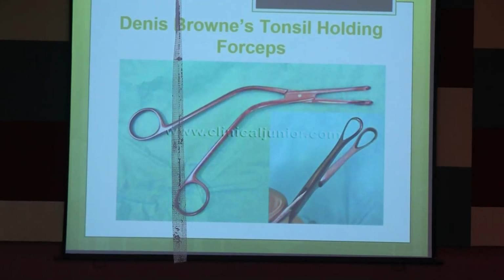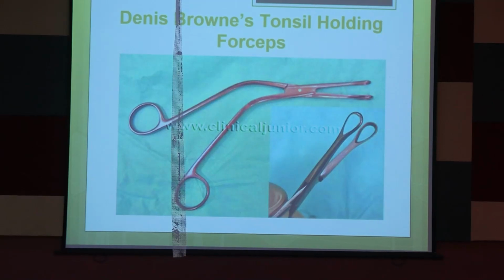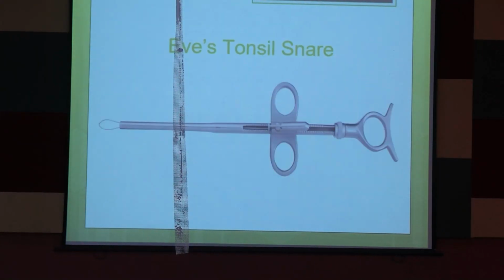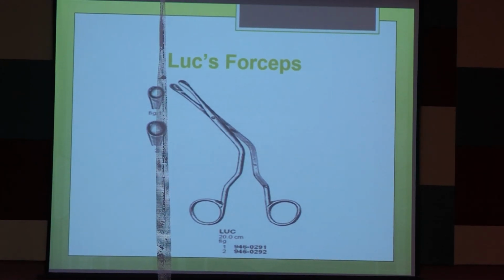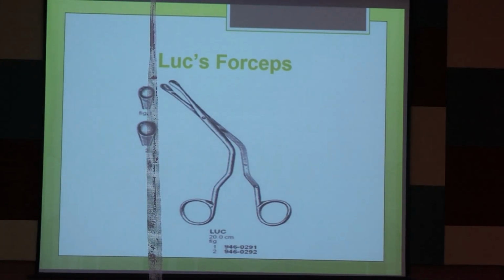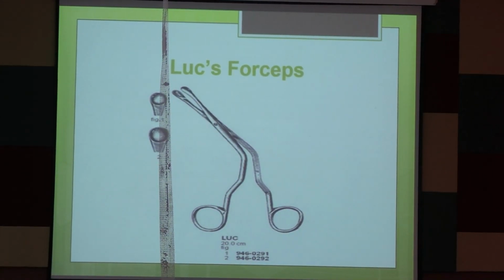First of all, the two blades will be a little different in size, the upper part is a little smaller, the lower part is a little bigger, okay? Again, anything else? The joint is completely different, right? That one is a box joint, this is a simple joint, okay? The curvature is different, the shape is a bit different, but they are frequently confused, okay?